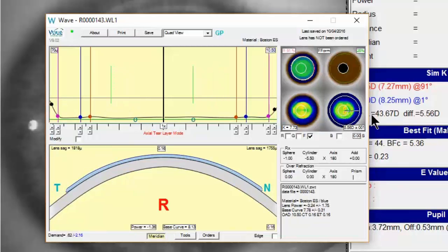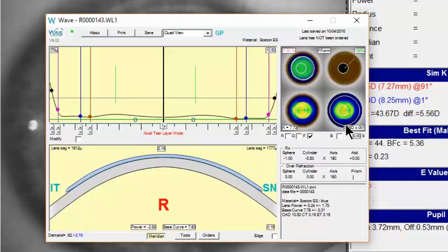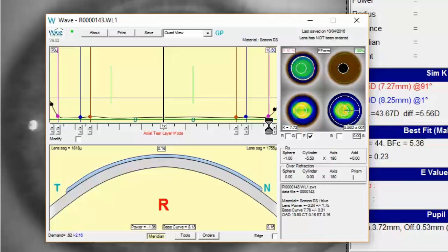So next we want to look for a moment at this bevel position, the bevel lift. A good starting point for this, if we click on the pink dot, is to set this at right around 4. You can see we're at 2.8 right now. So I'm going to click on 100% quadrant control, and we're just going to raise that up a couple of clicks. Now again, you usually like to start in the flattest meridian, which is usually the horizontal one. And so we're here. This is probably 3.6, so we're probably fine right there.